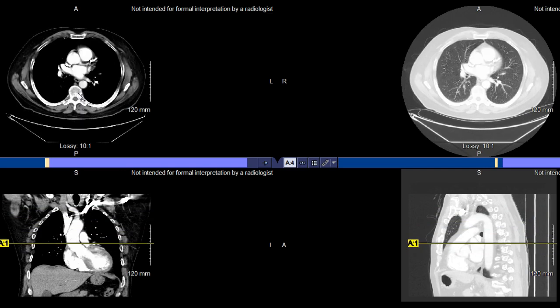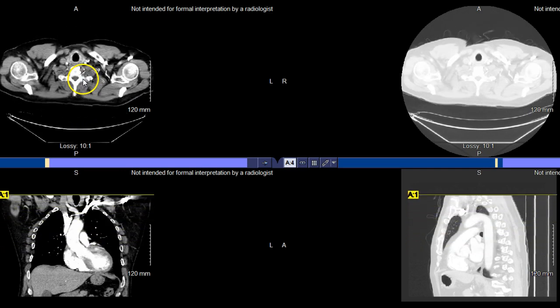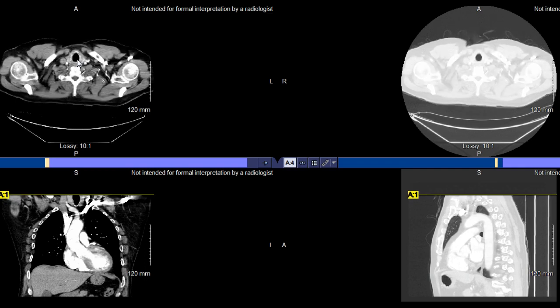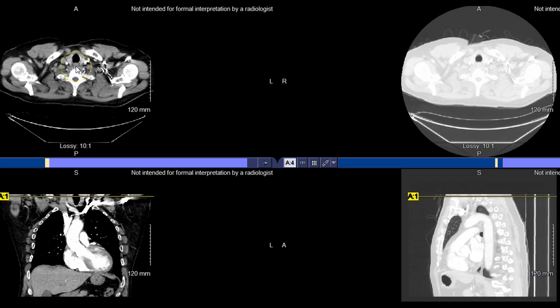To really start to talk about some of the other structures, let's look at the airway. I want you to see that transition in the airway and understand how the trachea looks and those points of bifurcation and what that looks like respectively. We're at the superior aspect, working a little more inferior. You can see that C shape of the trachea, with the cartilage-based rings on the front and not on the back. Subsequently, we have the esophagus here posterior to that.